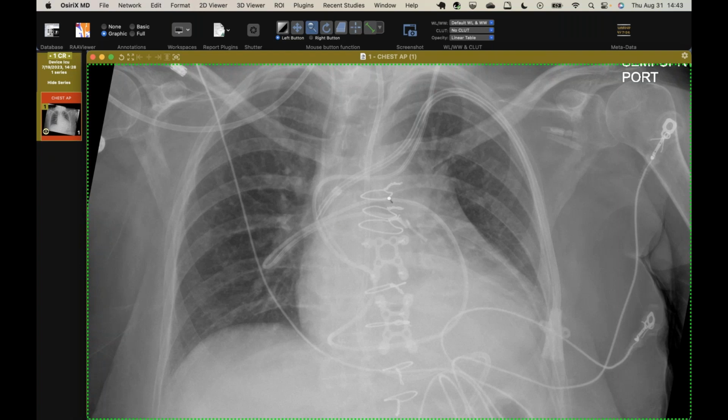And I just can't figure out how they looped this within a vessel, because these usually have a curve in them, and they're not so floppy like a PICC where they just float around. I don't know. Has any of you ever seen? I've seen them go out in different branches, but I've never seen one fold back on itself to this extent, unless there was some underlying stenosis, which I don't think there was. I would have thought at most you would dissect the pulmonary artery or do something, but it was unclear how they managed to get this catheter in this position.